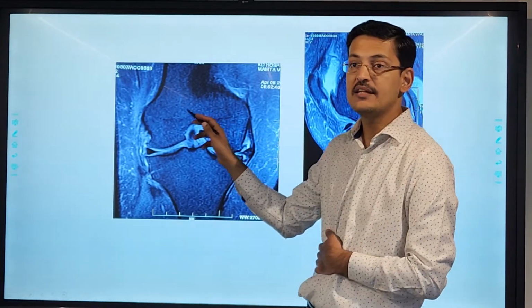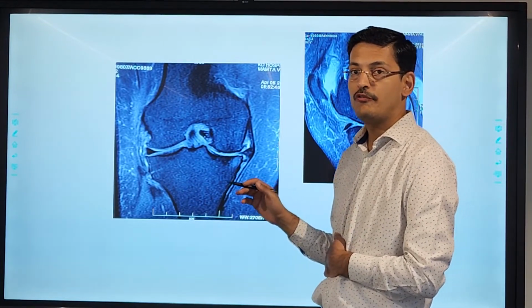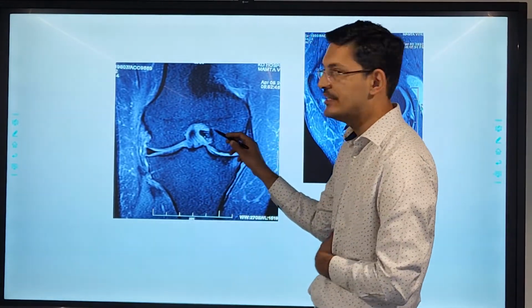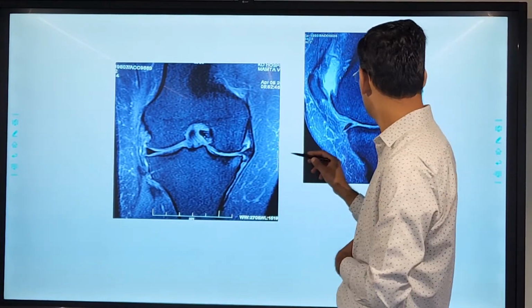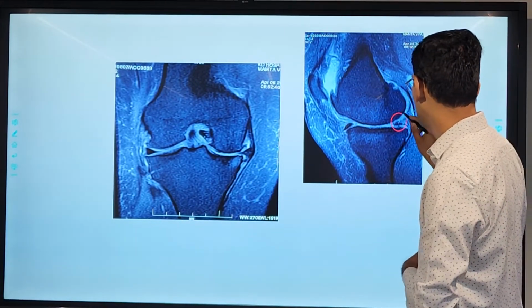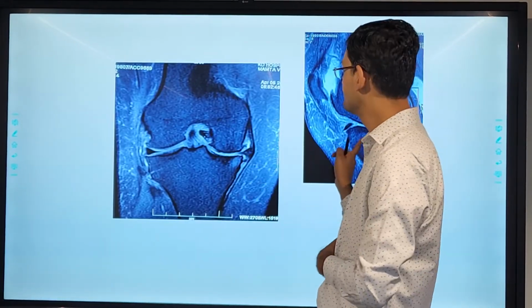Now these are her MRI. Now MRI pictures are really bad. So from my perspective also, the disease is advanced. Almost the whole of the meniscus is extruded. You can see here, there is a ghost sign here. Whole of the meniscus is extruded here.